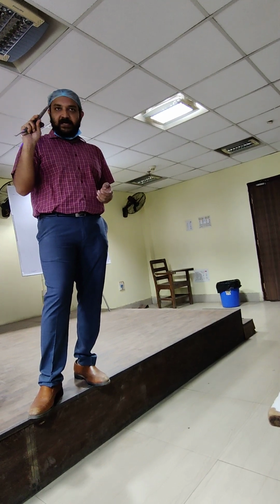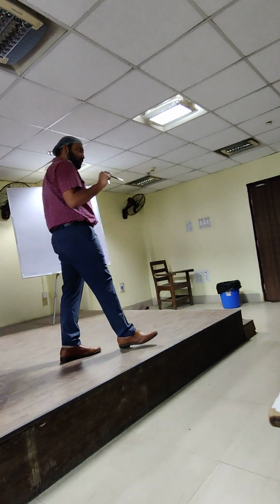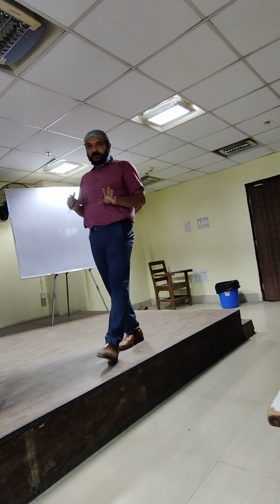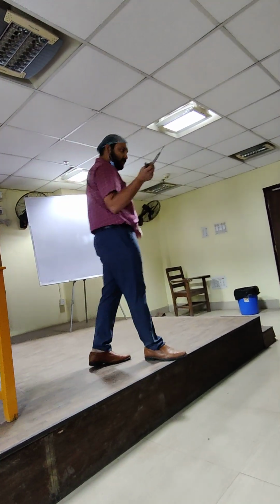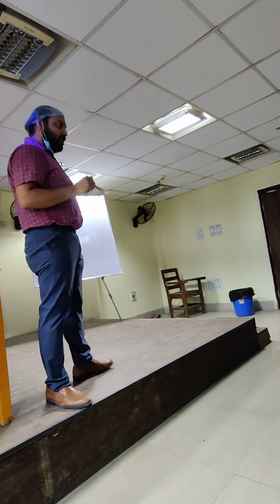তাহলে বেশি মেকানিক্যাল অ্যাডভান্টেজ আছে। যত বড় ব্লেডও হবে তাতেও মেকানিক্যাল অ্যাডভান্টেজ কিন্তু বড় হবে। So depending on the tooth that we are removing, we should select our chisel. কুবলেট স্যার আপারে না লোয়ারে ইউজ করব? These are mainly used for the lower third molars. Mainly. Upper third molar, there is chance of fracture of the tuberosity using a chisel, so better to avoid.